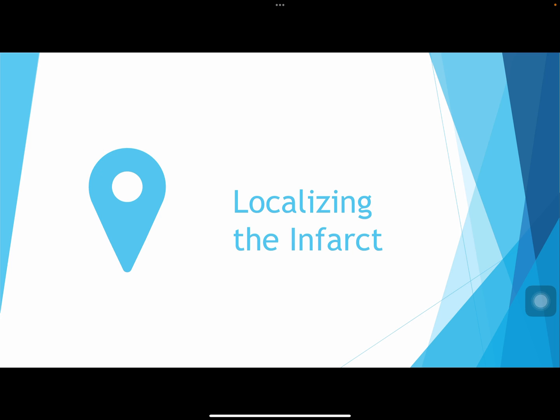But really, I think the big takeaway for this class is being able to recognize an infarct. So that last section, looking at the peaked T wave, the inversion, the ST segment elevation, the Q wave development, those are really the big takeaways. So when I talk about your final exam, for example, I'm not going to have you say whether it's inferior, anterior, or whatnot. Just being able to pick up that acute MI is going to be important.